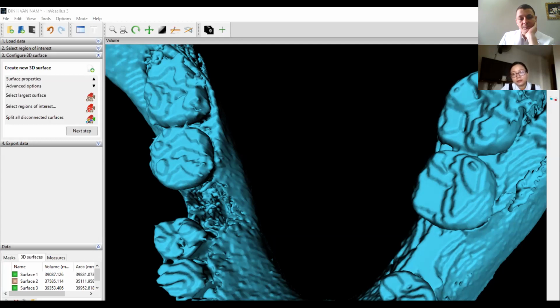Here you see why. You see that this anatomy of the alveolar bone, it's like this on every patient, meaning it's maximal at the level of the 6, but after it goes up, and at the level of the number 8, you almost have no alveolar bone.